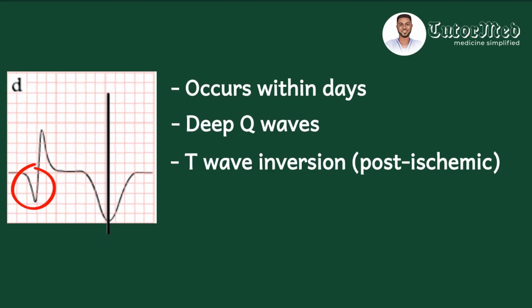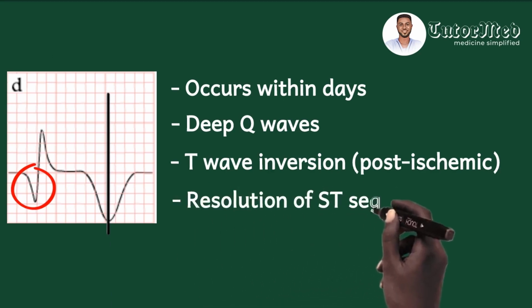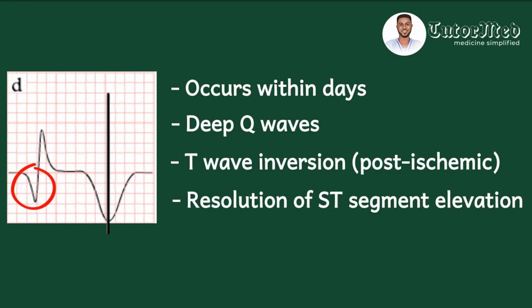And as you can see, there is a complete resolution of the ST segment elevation. The ST segment has come back to the baseline. And this brings me to the point that although the criteria for diagnosing STEMI says that there should be new ST elevation, you remember that rule in our previous video, although it requires that ST elevation has to occur, you've got to realize that if the patient comes to you later, you might not find ST segment elevation.